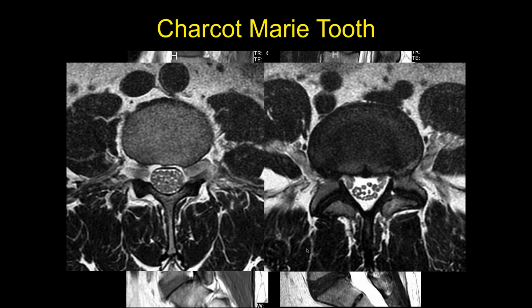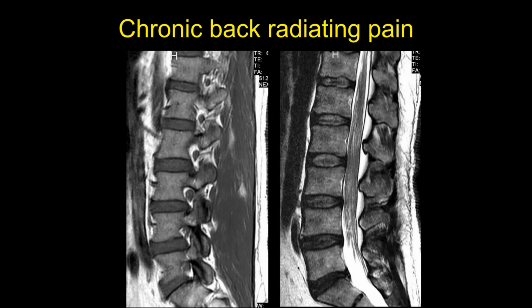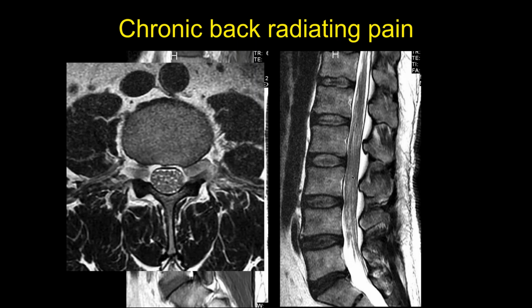In the sagittal you showed me first, those nerve roots are thickened. That's too big of a nerve root. It's a progressive disease, from the feet up, and I think at least paralysis and death at an early age. It's not a good disease.